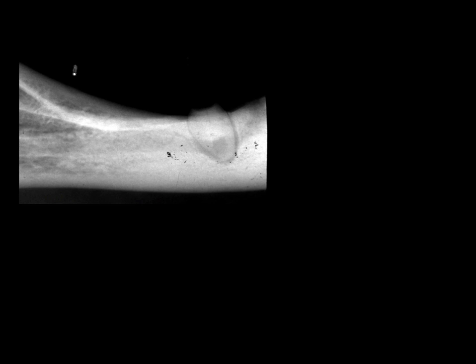Two views at different angles is relatively simple to carry out in dental practice, and will probably be the method that most of you use if you need to localize an object. Here's a practical example. This patient attended with pain under their lower denture. Clinically, there was a definite sore spot on the alveolar ridge in the lower right premolar region.